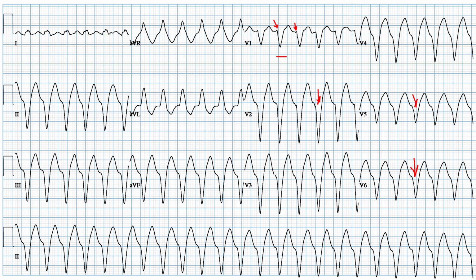It's just a morphology that's also very rare. It's extremely rare that you'll find a VT that was completely negative and looks like this, very unusual looking. It was put in the Brugada criteria, but if you look at this, it does not look like a bundle branch block at all. So this is almost certainly VT by QRS morphology criteria.